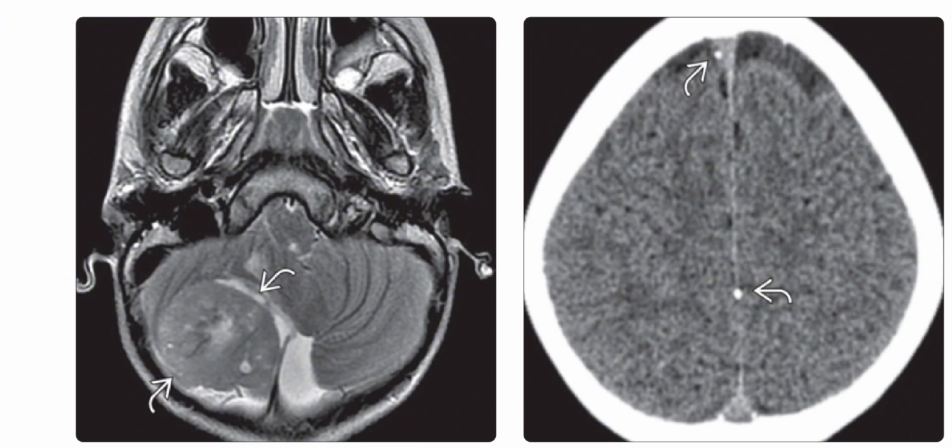On the right is the axial non-enhanced CT scan in the same patient, which was obtained preoperatively, and it reveals 2 small dural-based calcifications. Such calcifications are not normal in a child of this age, and they definitely should prompt a workup for basal cell nevus syndrome. And this syndrome was confirmed with a molecular genetic test.